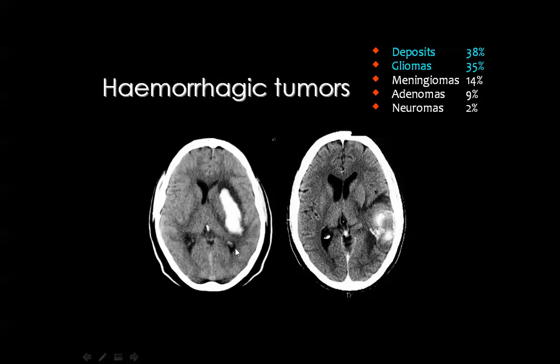Then if you see a hematoma inside the brain parenchyma, this hemorrhage may be one of two, either the hypertensive bleeding or the post-traumatic bleeding. Then a third source of hemorrhage inside the brain parenchyma is the tumor that has been the site of acute hemorrhage. And you know that many of the tumors, especially the aggressive ones, can bleed, and the most common lesions which show internal hemorrhage are the metastatic deposits and the aggressive gliomas, especially the GBM or the glioblastoma multiforme.